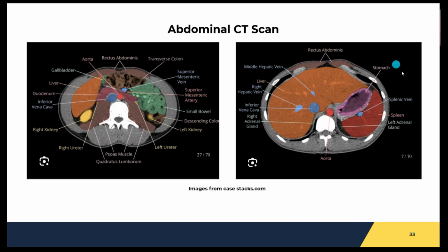Okay, so that was all of our abdominal X-rays. So now we're going to move on to CTs. So this slide shows just cross-sectional images of the abdomen. The key message that I want to get out here is that CT gives far more information than abdominal X-ray. You can appreciate the bowel gas pattern, but also soft tissues, vasculature, and the retroperitoneum as well. This is what X-rays can't do as well.